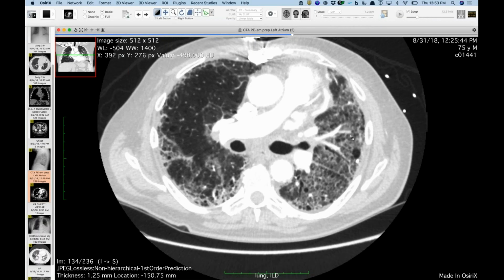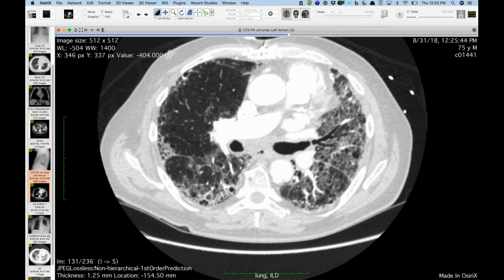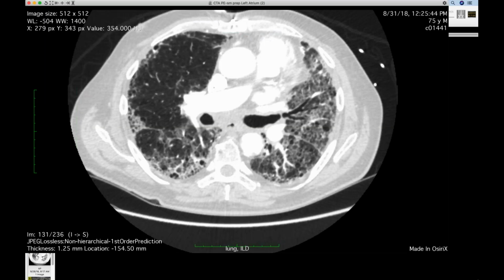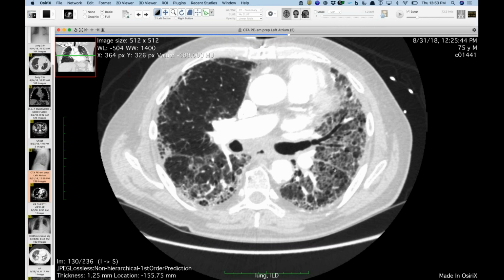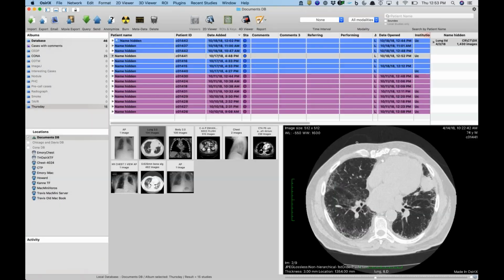But this is just the typical case: presents with acute onset of worsening dyspnea with a known underlying interstitial lung disease and has this ground glass, and you're never really sure if it's going to be acute exacerbation or pneumonia until they've been worked up. But in him, I think we have a pretty good trigger with the radiation.